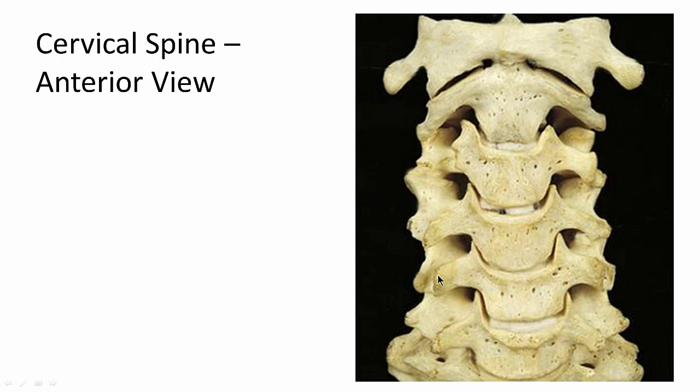This is the anterior root of the transverse process of C5, posterior root of the transverse process of C5. At the end we have a tubercle. If the dot is here, that's the anterior tubercle of the transverse process of C5, posterior tubercle, transverse process of C5, and this is the neural groove.